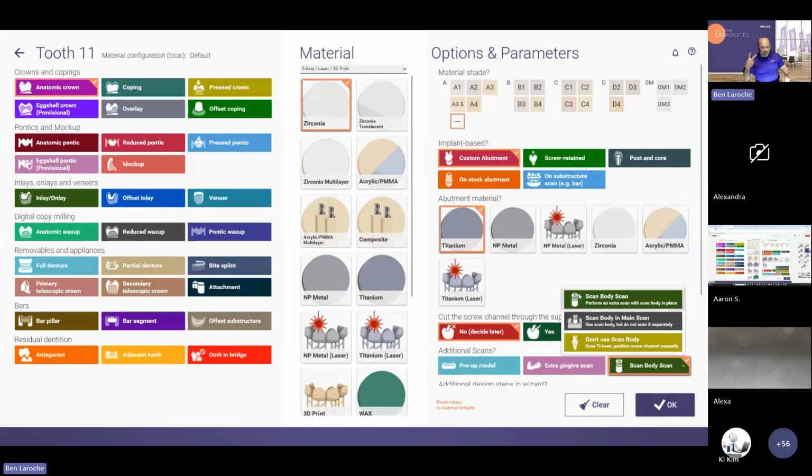Are there two different scans, one for my scan body and one for my jaw, or are they all in one scan together? Or I don't have a scan body and I'm just using the ti base. That last option is a fail safe in case they didn't take the scan body. In this case, it would not apply. You have all the components you need, so you're perfectly suited for a very accurate workflow and an accurate, predictable result.